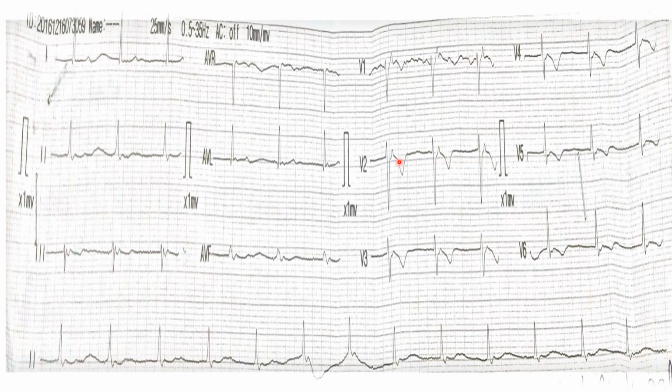Now what's interesting in this ECG is, so what do you think? Is this a normal sinus rhythm or is something else going on? For a normal sinus rhythm, what we know is that the P is the driver of the circuit. So the P wave has to come earlier than the QRS. But what's happening over here is that there seems to be no relation between the P and the QRS. So is it AV block or is it sinus node dysfunction?